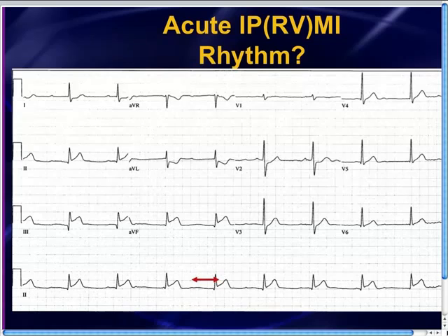Now, I mentioned there's a little blip right there, and then in this T wave, I don't see anything, to be honest with you, but I'll keep on moving it across, and then there's the P wave that picks up again. So when you move these calipers all the way across, it turns out that there is a steady and normal P to P interval that goes all the way across, and therefore you have to assume that these are in fact P waves. All right, so you've got P wave activity, you've got atrial activity in there after all.